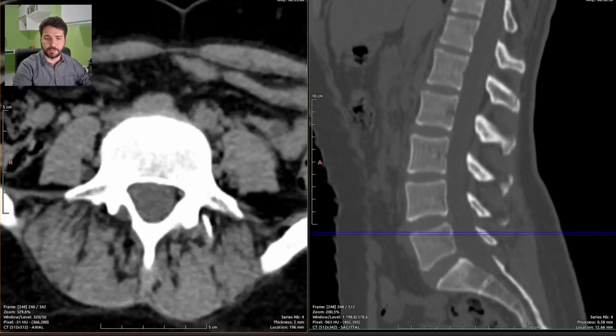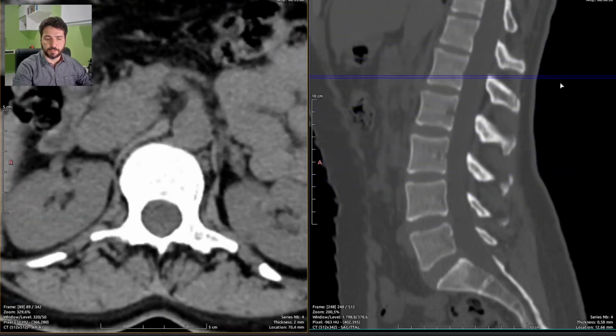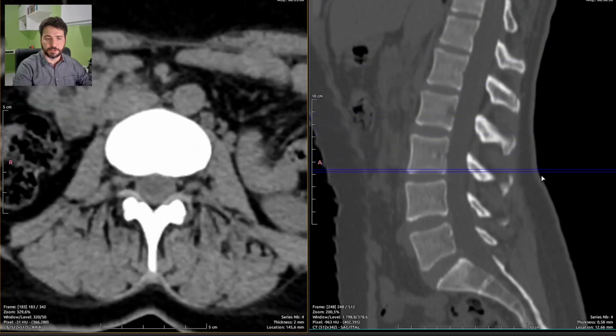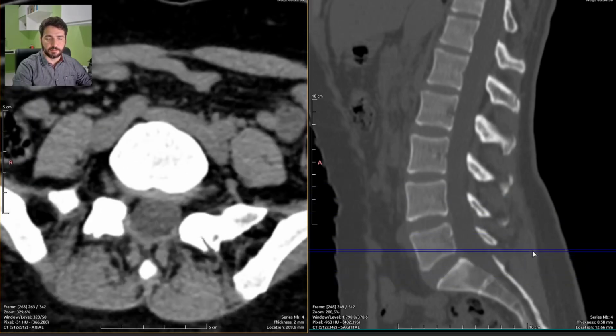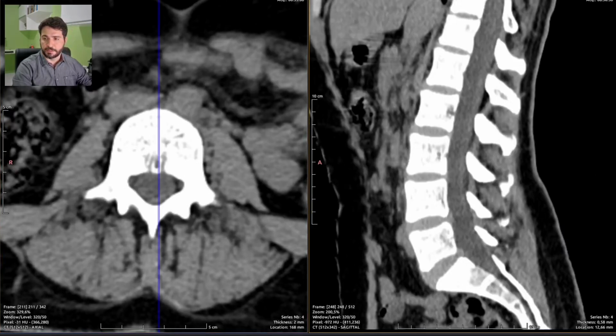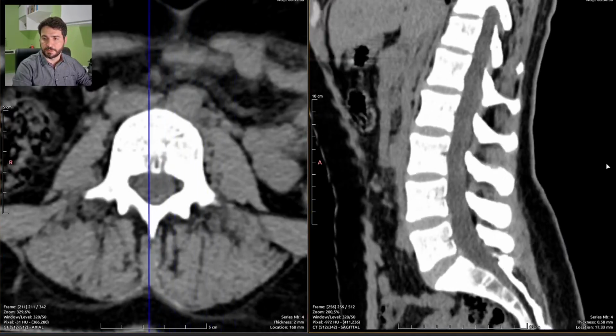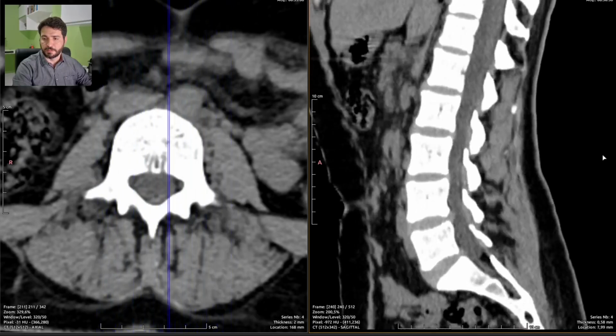This is quite common and usually related to chronic pain and chronic denervation. Maybe not in this case, but this patient is quite young. Still, I wouldn't be surprised if this gets worse, no matter the treatment. So, yep, no fractures.